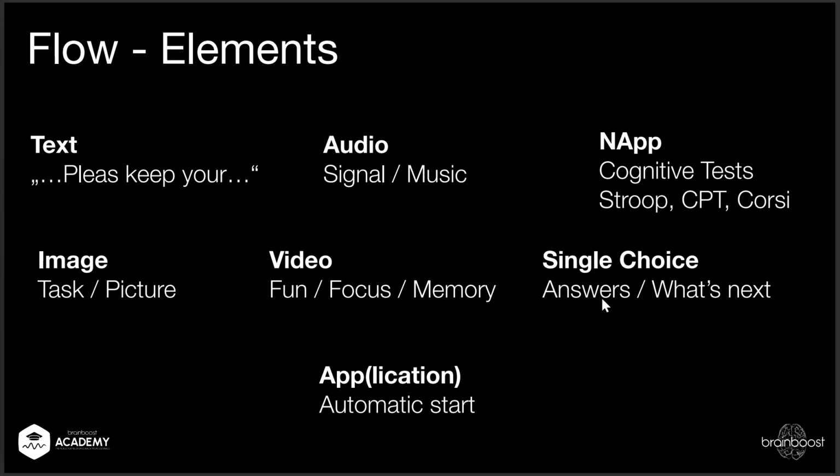So it can be a video. It can also have an element for single choice answers. So after a video, you don't have to ask them and know them by heart. It can just be displayed. I will show you. And what do you want to do next? It can automatically start an application like the Focus Master or Dragon Bay or whatever game you want to play, like an application.